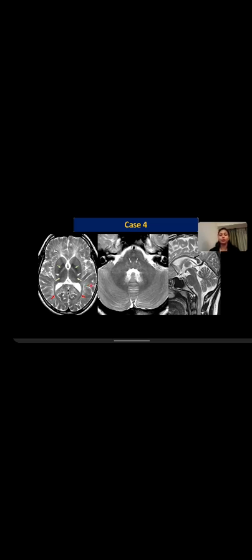So if you don't remember anything in hypomyelinating leukodystrophies, remember Pelizaeus-Merzbacher disease, remember Pelizaeus-Merzbacher-like disease, and remember this disease, which can be a spotter and which can be a little common as well when we are dealing with hypomyelinating leukodystrophies. So we are seeing diffuse hypomyelination. In addition, there is sparing of certain structures. So what do you think is this structure?